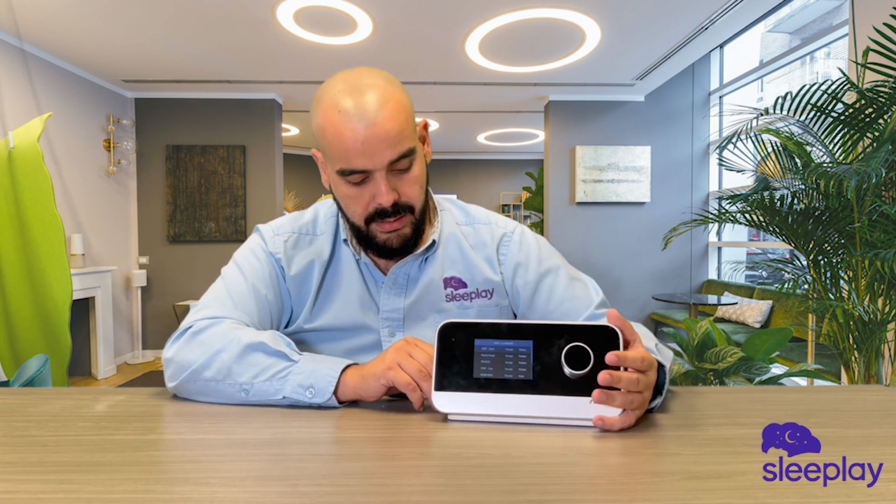When you want to read your data off the SD card on the machine, you're going to have to download the web-based app for your computer, so that you can actually download the data into your computer, because it's not just plug and play. You do have to download a separate program, and we're going to provide links down below for it. Unfortunately, for now, the program is only for Windows-based computers. We hope that soon Resvent will allow Mac iOS users to also have an app.